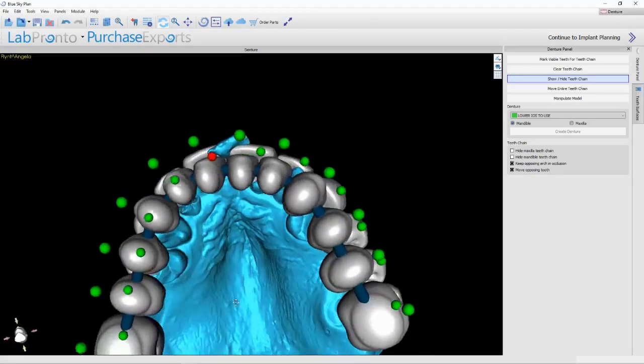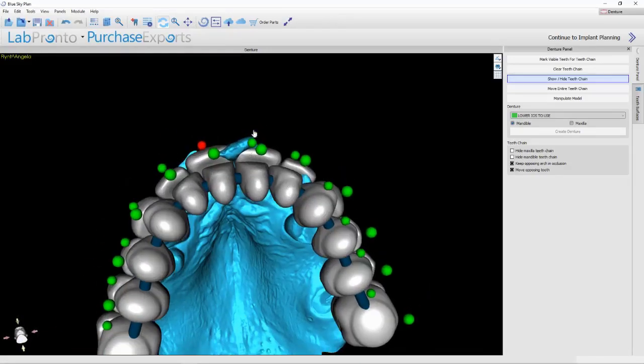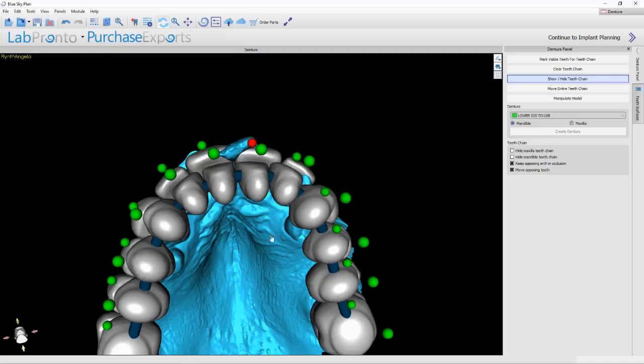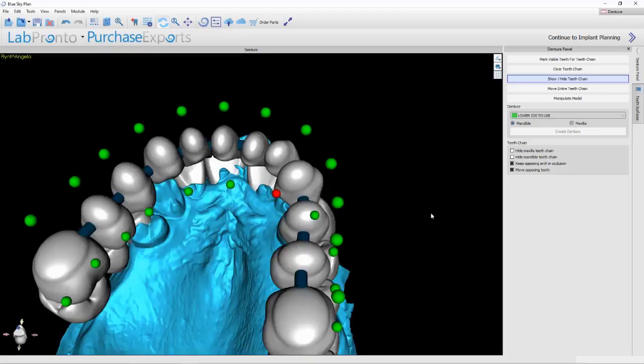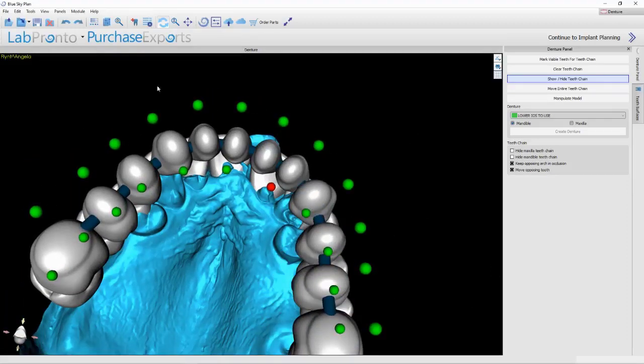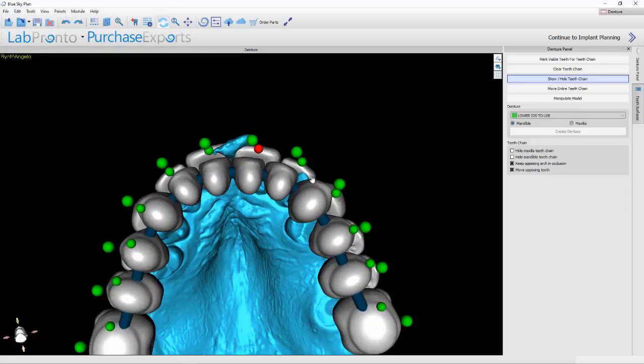Alright, still need to come back some more, but rather than doing it all from the central, I might opt to now rotate from here and just gradually kind of start bringing things back. And see, there's an example. I went too far. So let's Control Z that. Control Z. And let's try to do it just a little bit.